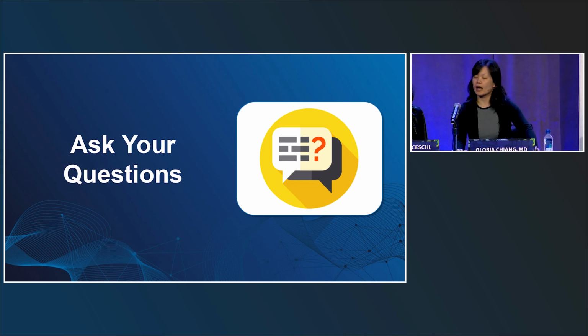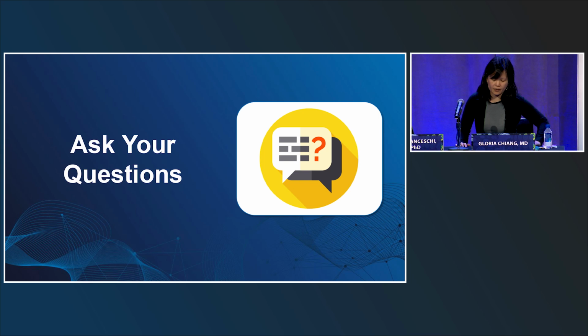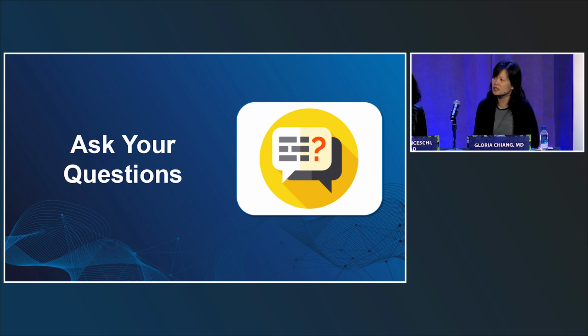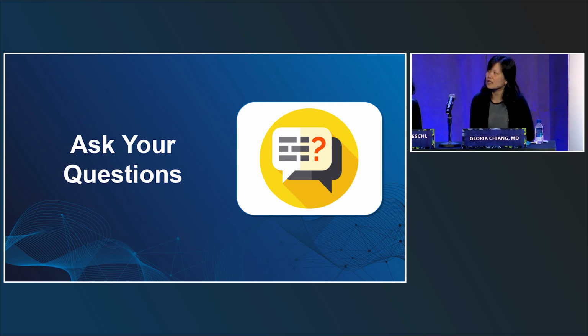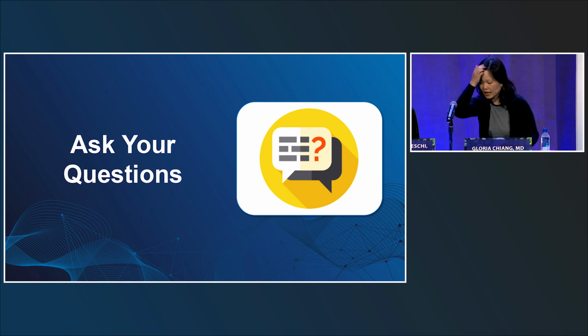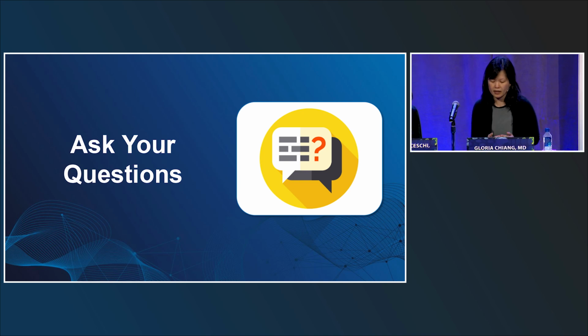Dr. Pinter asked us, does ARIA-H occur without ARIA-E? That's an excellent question. And so ARIA-H, if you recall, with microhemorrhages, we can see spontaneous microhemorrhages in older people just in general. So it's really tricky in the setting of these anti-amyloid therapies. Is it microhemorrhage just from their baseline vascular disease, or is it microhemorrhage because of ARIA? And we don't have a great answer to that. I've asked a lot of people at different institutions, and the consensus is, even if it's a microhemorrhage, let's say we've seen some in the cerebellum, where there is no amyloid, even if you don't think it's related, you have to report it as ARIA-H because it's in the setting of this medication. So yes, I have seen ARIA-H without ARIA-E.